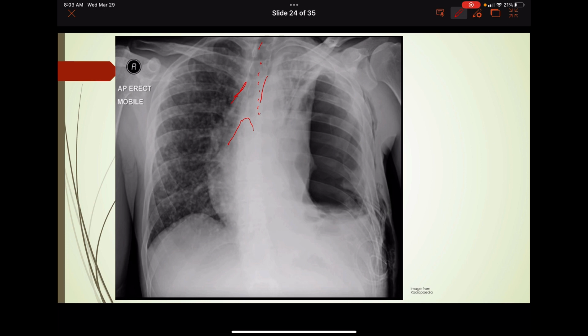So B for bones, the patient's right side. Ribs look okay, clavicle looks okay. Patient's left side, though, looks to be a mess. Since this is cut off, it's probably a clavicle fracture up there.